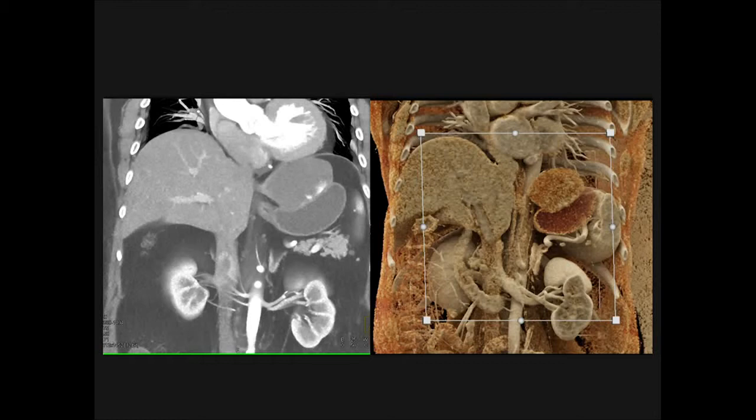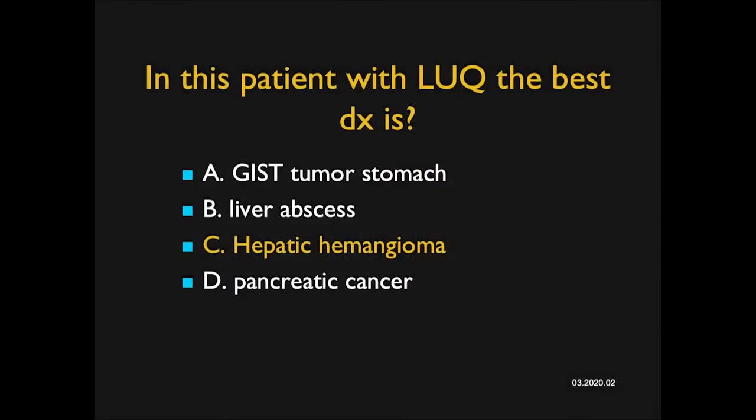And if you look carefully, this was not a gastric mass, but this was a hemangioma arising off the left lobe of the liver, pushing against the stomach. And it's a great example of hepatic hemangioma. I've seen this case mistakenly called a gastric tumor. I've seen it being called a pancreatic tumor, a retroperitoneal sarcoma. Again, what helps me out just on the couple images I gave you is the rim enhancement, that classic puddling that you see with hemangiomas.